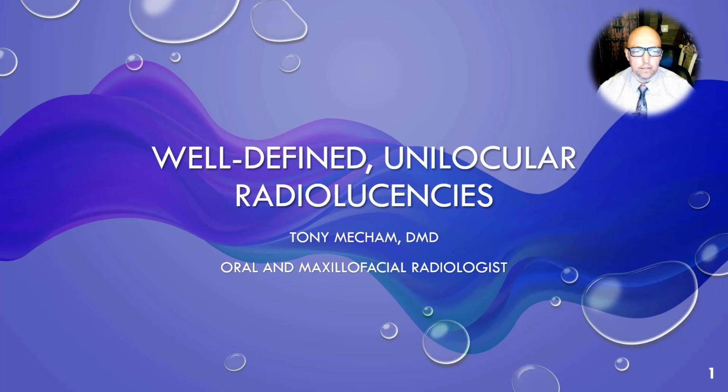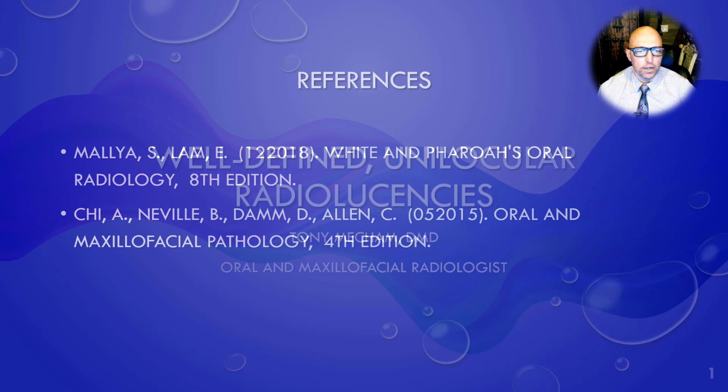I don't have it split out by location because most of these occur most commonly in the posterior mandible. All of these can occur anywhere, but of these lesions, for the most part, they're going to be most common in the posterior mandible anyway.